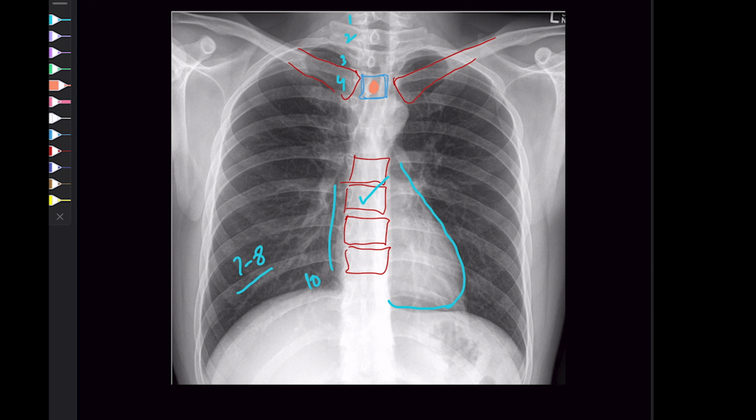And then another point, and that will tell me about the angulation. How do I determine the angulation? For that I have to erase this little bit here. I need to erase all that. So now I'm looking for, so let me redraw it. This was my clavicle. We all know about that. Now there you can see very clearly this is my first rib.